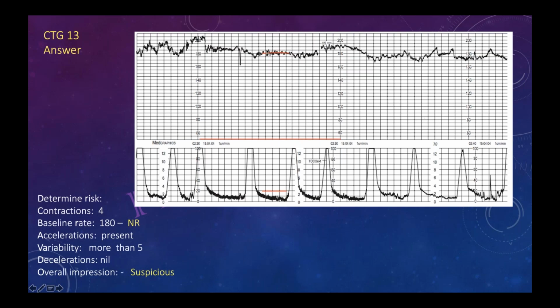Okay, so depending upon the situation, if it is more than 180, then you will put this under abnormal, and if it is less than 180, you will put it under suspicious. But for any kind of CTG, what you will do first, you will start with conservative, then you will observe. Maybe this will improve by itself. Maybe some maternal tachycardia is there. Because we don't have the scenario, like what was the condition of the patient, it will be very hard to describe it.